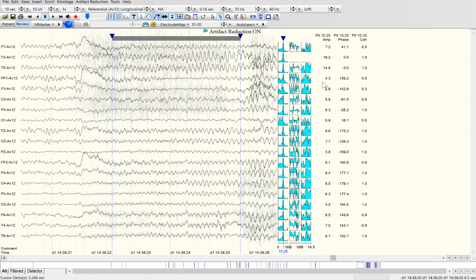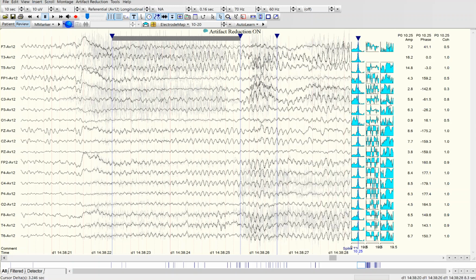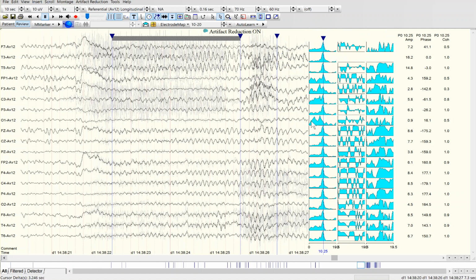So let's move this over because everything kind of got squished. And if you notice, the arrow becomes a two-headed arrow. There's no visible boundary there, but if you put it between those, it'll become a two-headed arrow. You click, and you can move these things around. You adjust the spacing that you want. Do that on the left side. There we go. And a little bit more. All right.